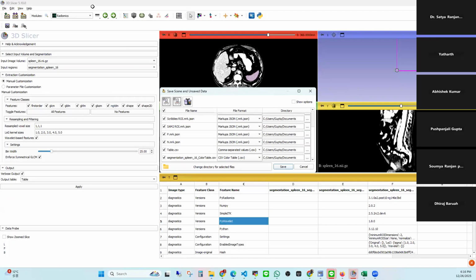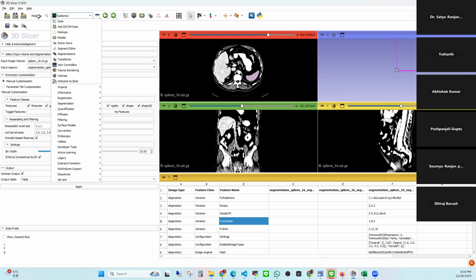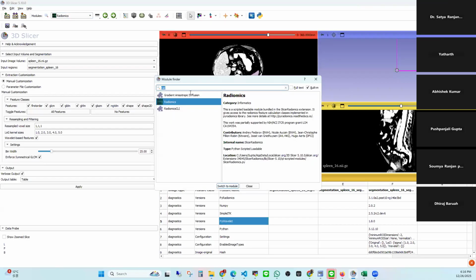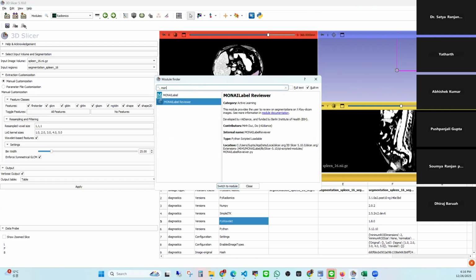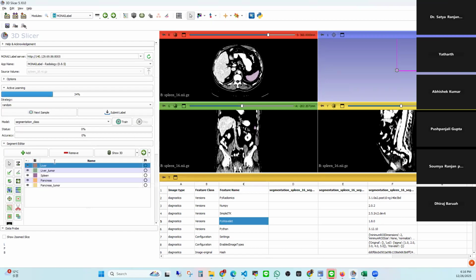Remember in 3D Slicer we had 5 types, 5 classes, I mean. So those 5 classes will be seen over here. If you do not have any label for one, they will just keep it blank. But the class label will be on the top, as a column created for the class. We have 5 classes over here: liver, tumor, spleen, pancreas, and pancreatic cancer.